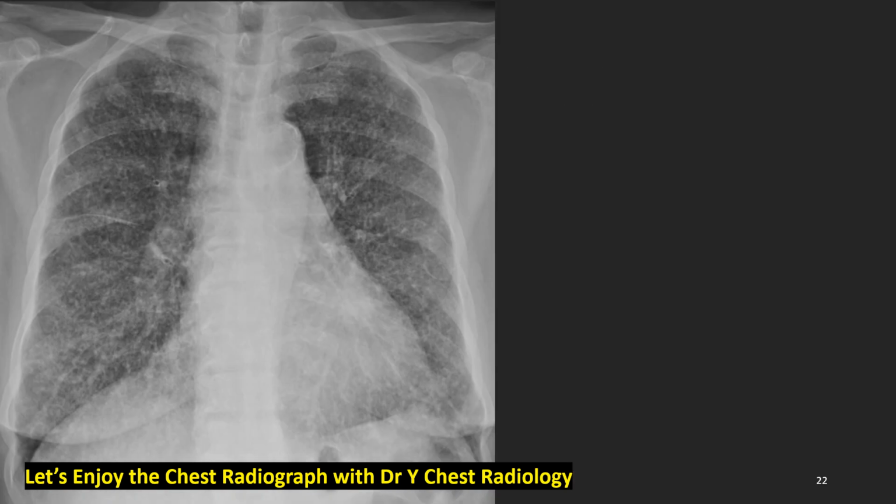What do we see in this old woman's chest radiograph? Yes, uniform micronodules. Micronodules usually means less than 3 millimeters. Uniform micronodules, bilateral. And how about this?